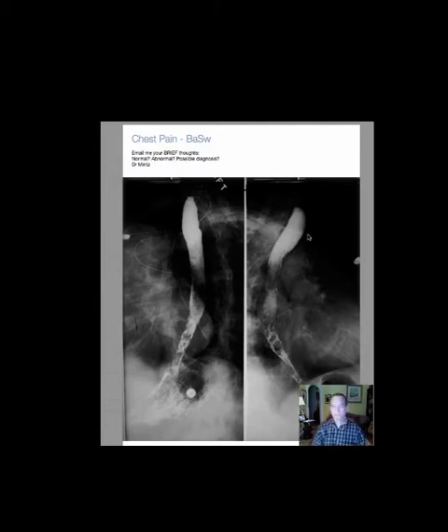So, suffice it to say that this is an abnormal esophagram, and there is poor filling of the distal esophagus with narrowing, which may or may not be persistent or real, but it doesn't matter. The point here is to just describe what you see. It's a somewhat narrowed distal esophagus with irregular margins and possibly some filling defects. That would be perfectly adequate for our purposes.